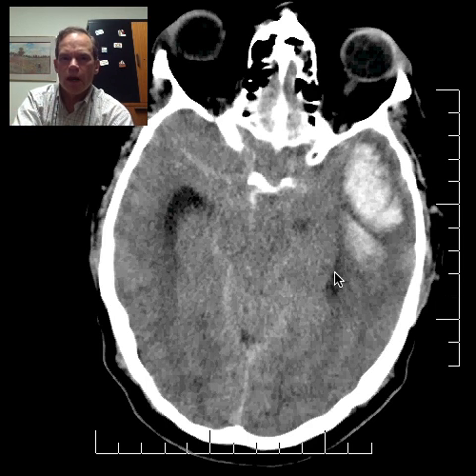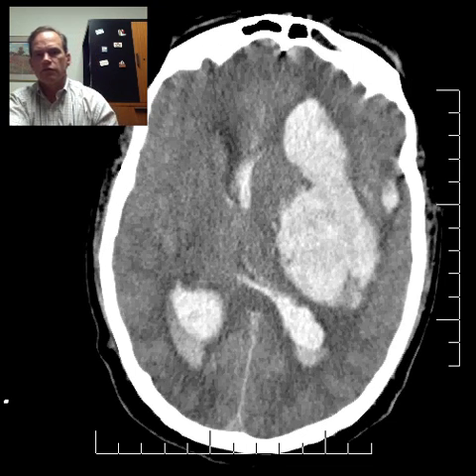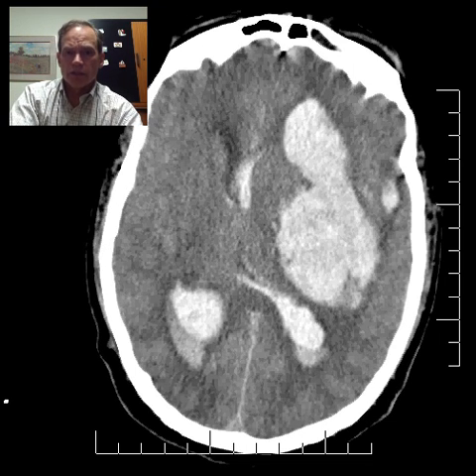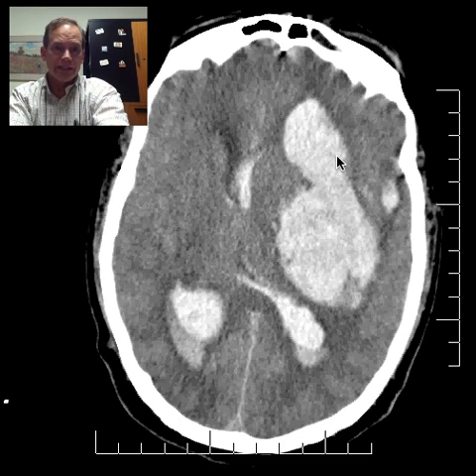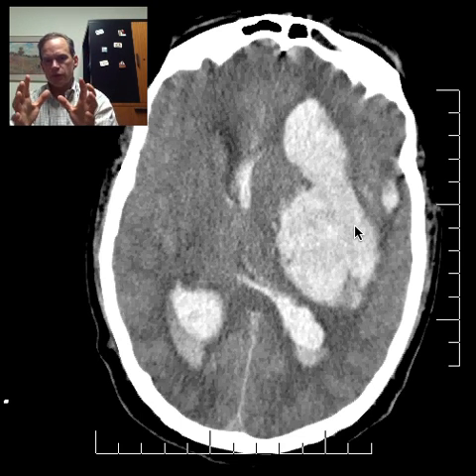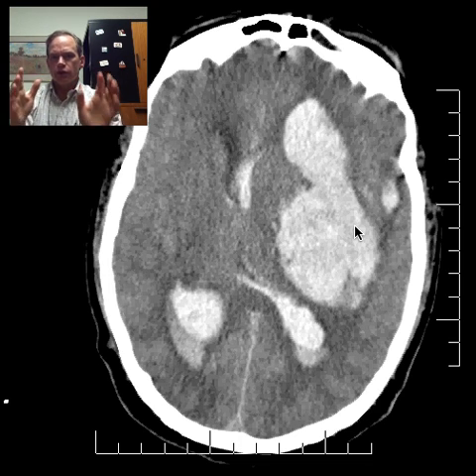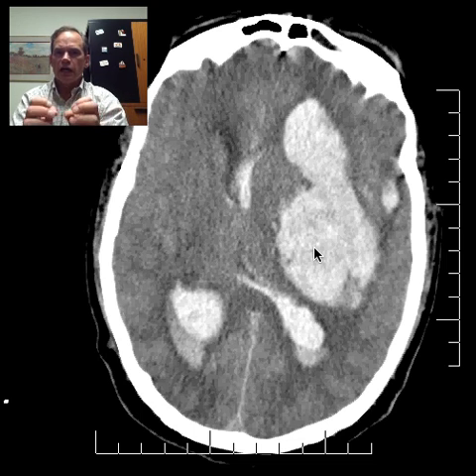But it's crucial, because this hemorrhage up in the hemispheres is disastrous looking, very ominous. But the fact is, if it were smaller, or if we were able to get in immediately, just for the sake of argument, and evacuate this entire hematoma, the hemisphere could come back and there could be a great deal of recovery, because this is not hemorrhage of the brain tissue, it's kind of dissecting.